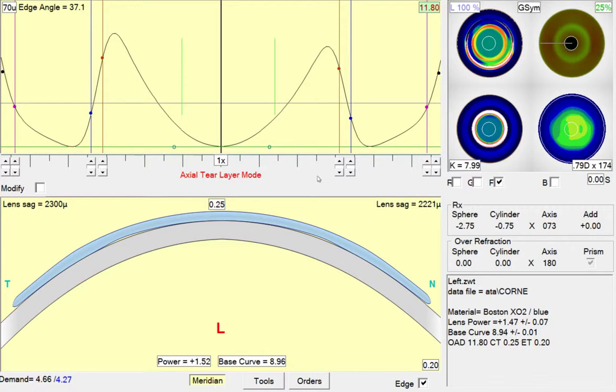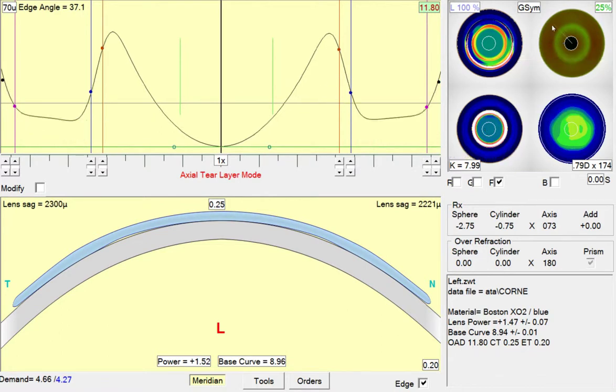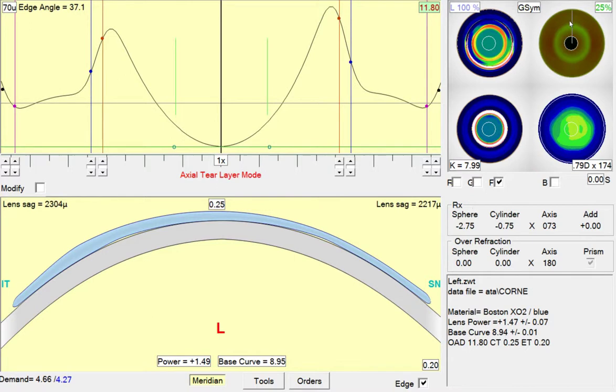We didn't make a huge change with only a quarter diopter. If you make changes on the order of half, 3/4 of a diopter, you will find that you sometimes end up with a very unusually toric base curve, and we do want to fine-tune each of those meridians. So I won't go through and do all of them right now, but we did a few of them just so there's a demo and an idea of how to do that.